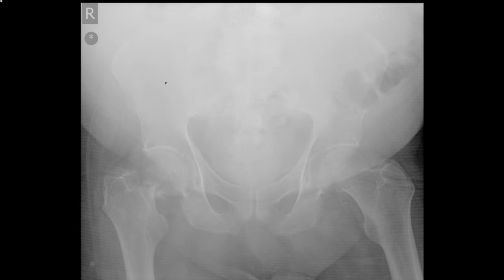As shown in this radiograph, there is an R, which indicates right, as in all radiographs, but there is also this star. Many hospitals use a system by which the radiographer, when performing the radiograph, if he or she thinks there is an abnormality, will put a marker on the image. In our hospital here, we use this star system. It traditionally was a red dot when x-rays were on film, and the radiographer used to stick a paper red dot on the image. Now we use something like this. So in the radiographer's opinion, there was a significant abnormality on this image.